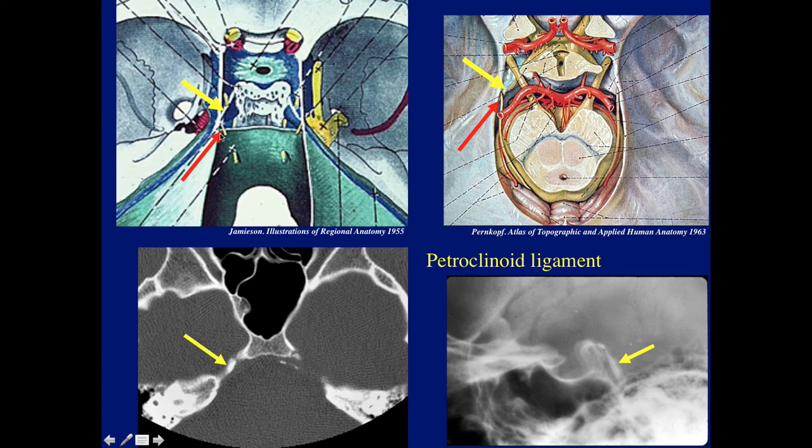The issue here is that here's the ligament, and the trochlear nerve, as it travels towards the cavernous sinus, passes right over this ligament, which is outlined here, and you can see why there would be trauma or damage, again in herniation or contusion, to this nerve as it gets banged against the petroclinoid ligament.